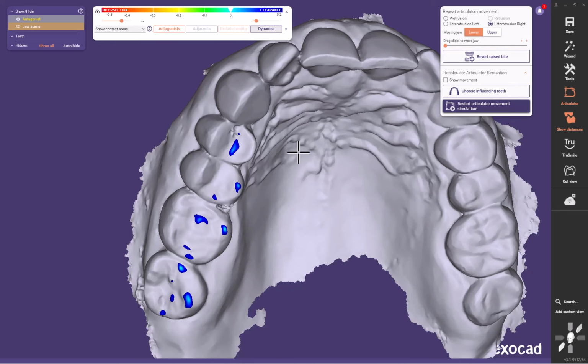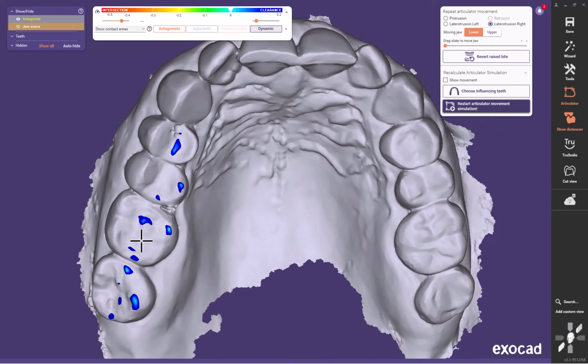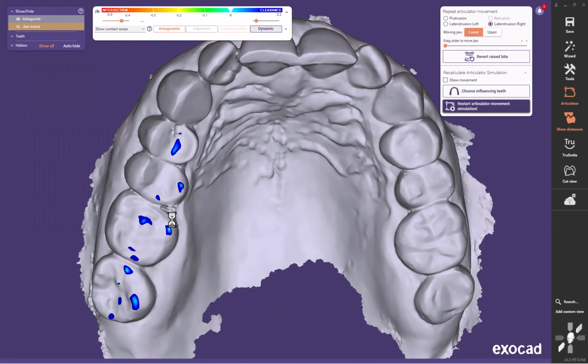Okay, so hit OK, and now rerun the movement, and we'll see if it brings up any more here. I'm going to say no. I'm going to say that that's pretty much stable, so nothing else came up that I need to deal with. Nothing's on an incline here. These are all on cusp tips or flat surfaces. You might could say that is just a little bit.